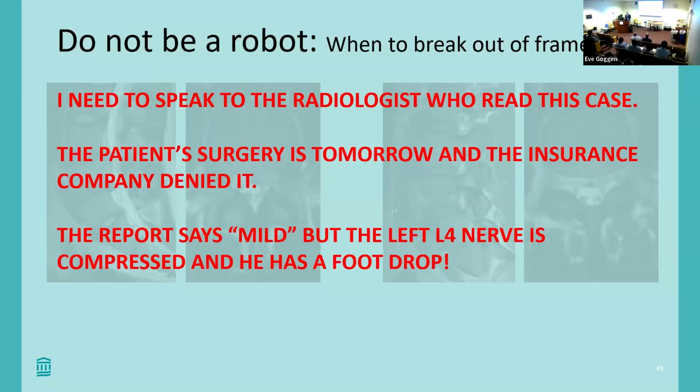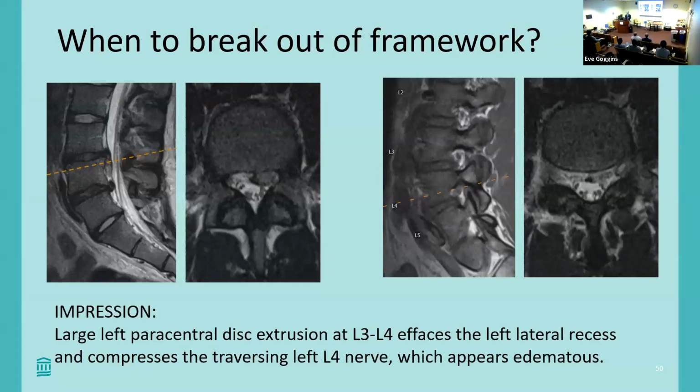Everything in that report might have been correct from the grading of the various stenoses and the description of the disc bulge. But if something is unusual, or a nerve is compressed, or the nerve is hyperintense in signal intensity, then you have to describe that. So let's revisit this and recreate this report, so that someone not seeing the images can recreate what's happening in their mind.